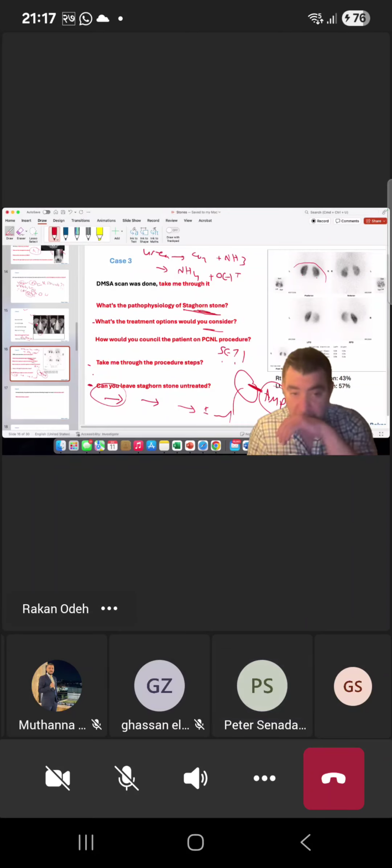If you don't mind, please, can you comment on it in a few words? Well, you mean the DMSA scan? Yes, can you comment on this? An ideal comment, more than what he said: This is a DMSA nuclear scan. It shows almost equal uptake in both kidneys. I can see the posterior and the anterior view, and both have the same uptake with almost similar split function. Nothing really major about the DMSA scan.